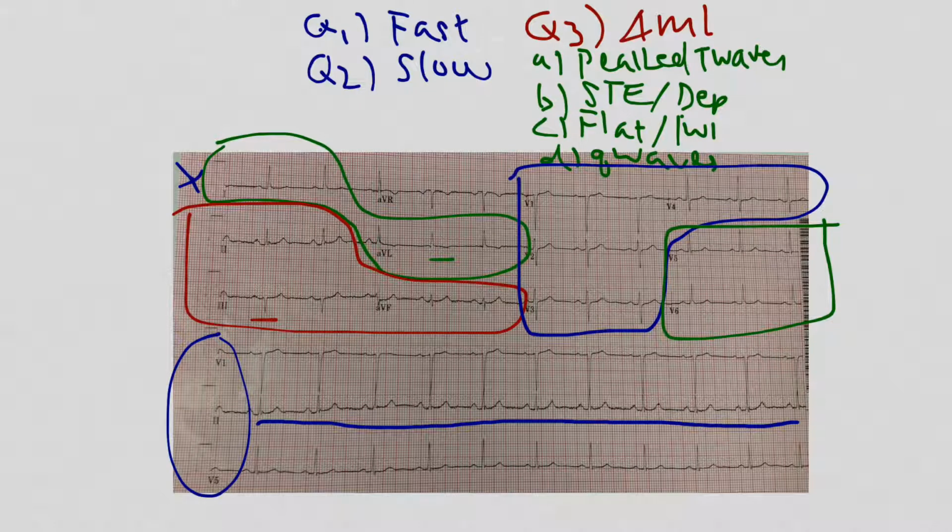So in summary, for this EKG, we see that it's not too fast or too slow. The patient doesn't need any electricity. And looking through all the leads in a geographical distribution, we don't see any evidence of any ischemic changes that require activation of a cath lab.